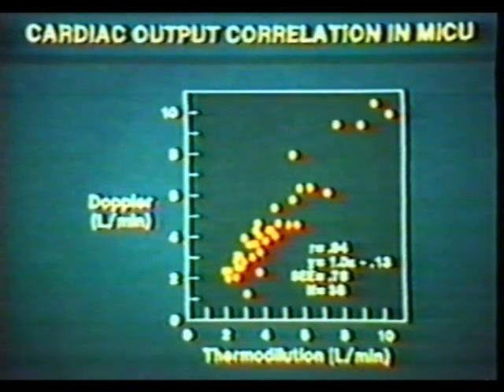Several authors, including Dr. Rick Nishimura at our institution, have shown that this non-invasive Doppler method for measuring cardiac output is indeed accurate. In this graph, the cardiac output measured by Doppler in the medical intensive care unit is compared to that measured by the standard invasive thermodilution technique. You can see the excellent correlation.